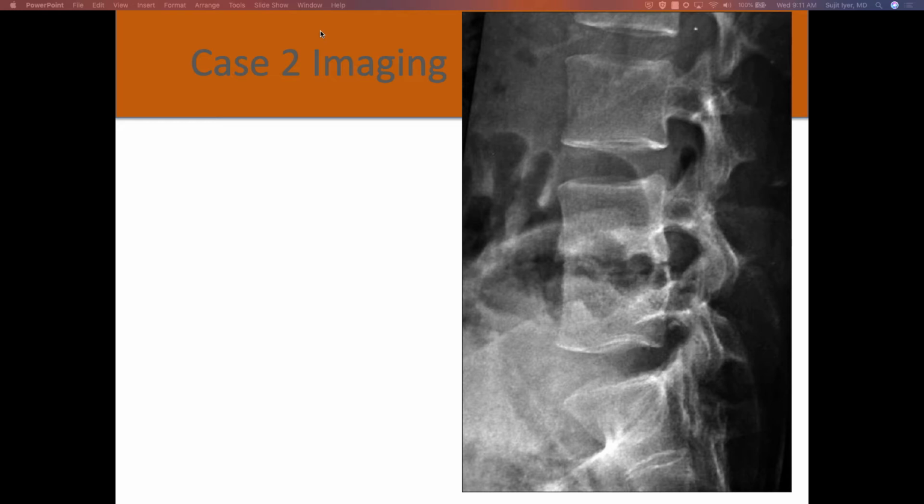Right. If you look at the disc above, that's what I like to do to get a visualization of what looks normal. You see the vertebral body, the disc, vertebral body, the disc, vertebral body, and then it doesn't look quite right there. At the disc, there's a sclerotic line called the vertebral end plate, and that's normally intact.